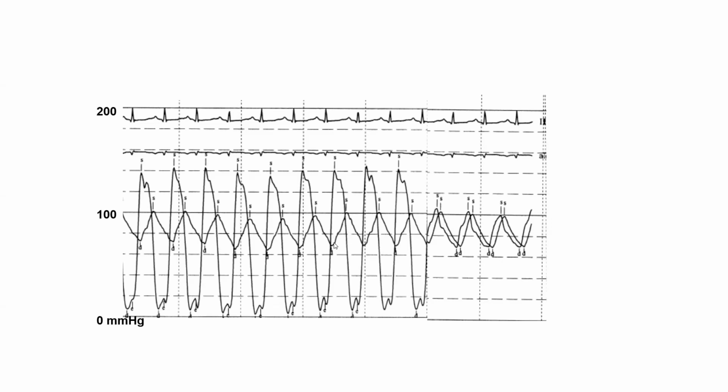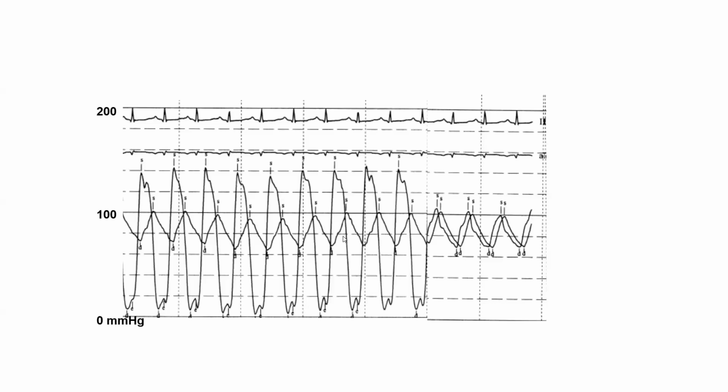The lower that anacrotic notch is on the upslope, the more suggestive of severe AS. Again, the anacrotic notch corresponds to the valve area, to the flow limiting point. So the smaller your valve area, the lower that anacrotic notch will be on the upslope. You need a properly damped tracing to see it. It definitely wants to be below the midpoint of the aortic upstroke.